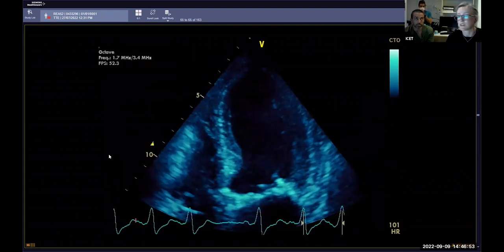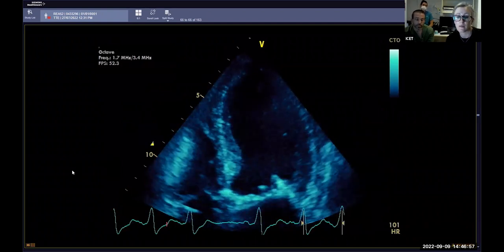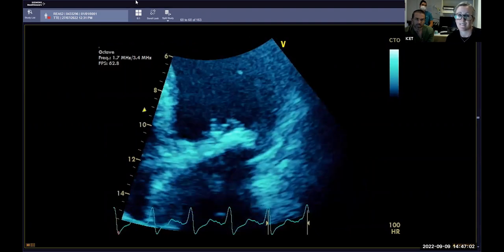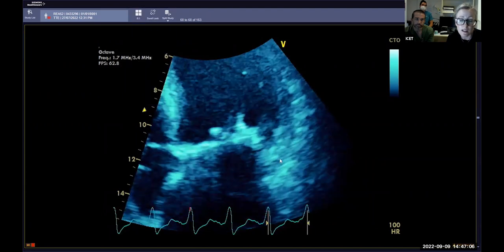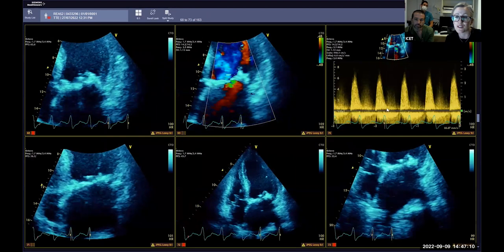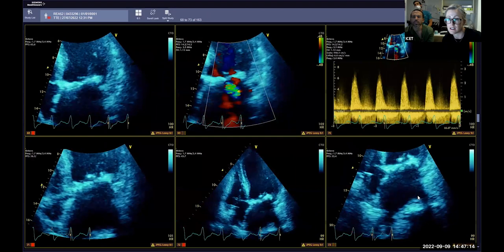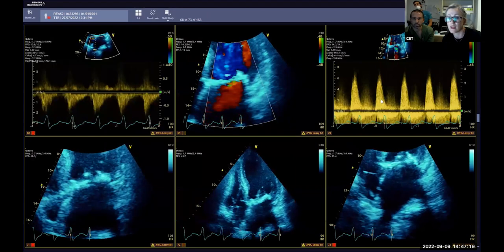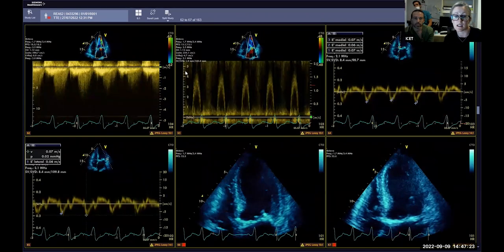Obviously the mitral area less than 1.5, right? Yeah, less than 1.5 centimeters squared. The pressure half time would be 150, and that's what's in the guidelines. So we start to go above that. I don't think we've actually measured a pressure half time on there, because the focus of this study is not about the mitral valve. But if you were just to eyeball that, the pressure half time looks pretty steep, doesn't it?